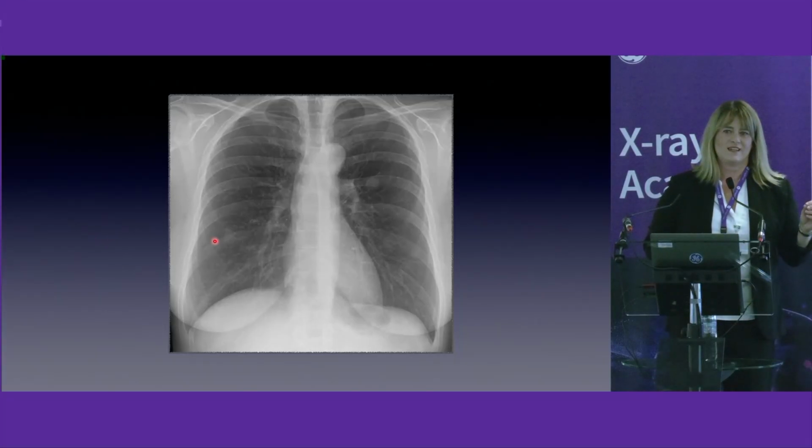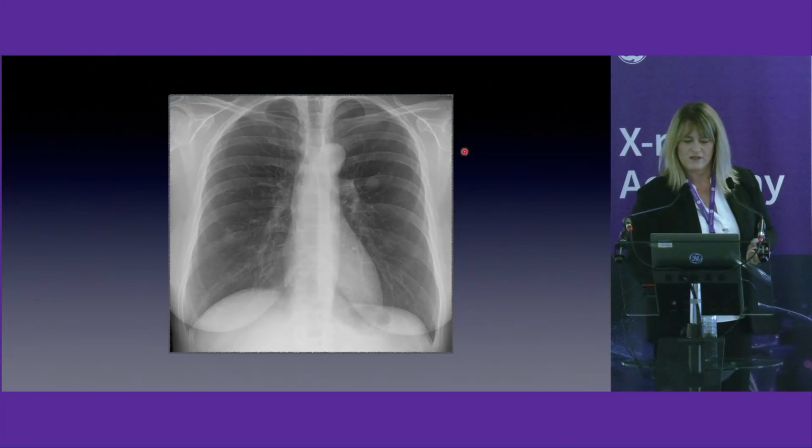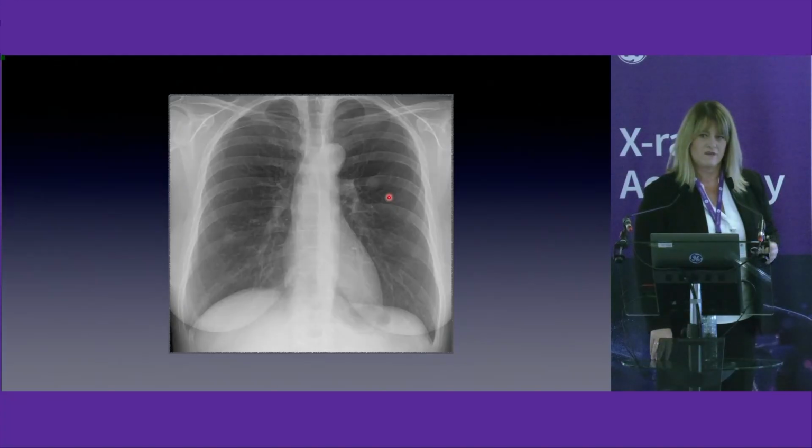Anyone? You only have this. Maybe there are more nodules. So can you tell me if this one belongs to the parenchyma, or this one belongs to the parenchyma? That's the point. Sometimes we can't say that from this.